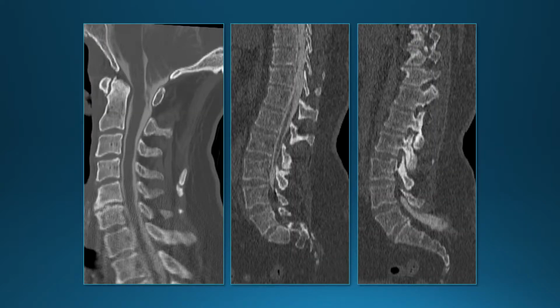This is a myelogram in a patient with a Chiari 2 malformation. You can see the characteristic appearance of the fourth ventricle. It has a very narrow AP dimension with the cerebellar vermis extending through the foramen magnum. Lower down, you can see the remnant of the repaired myelomeningocele.